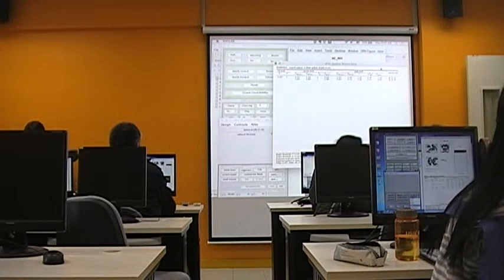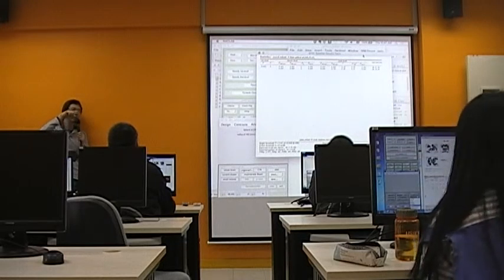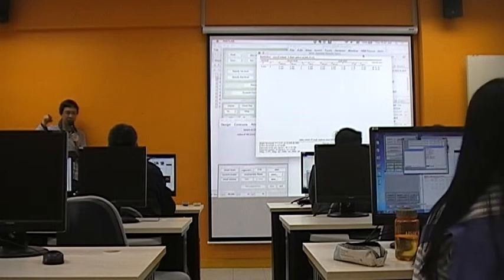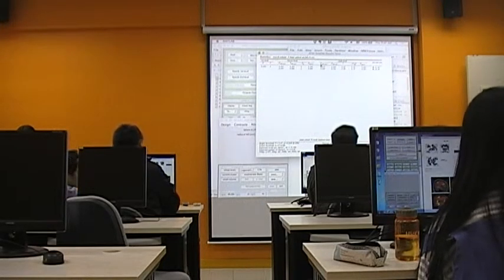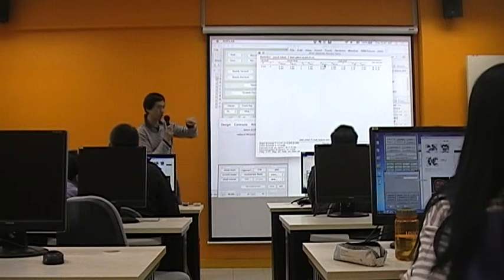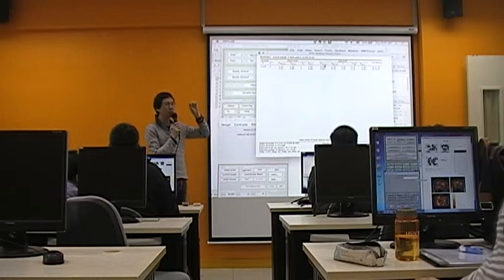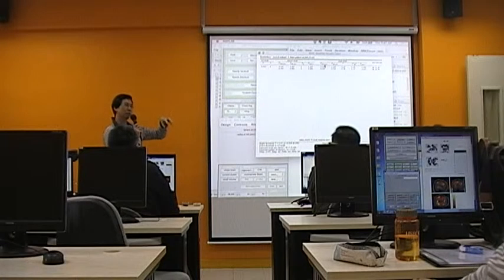Here, there are two peaks within the search sphere that are significant in this case. If you take a look at the first value at the peak level, this is the P for FWE corrected. I know the screen resolution is not so good, but on your screen it should be much clearer. So here you are still doing family-wise error correction, but only restricting within the sphere.